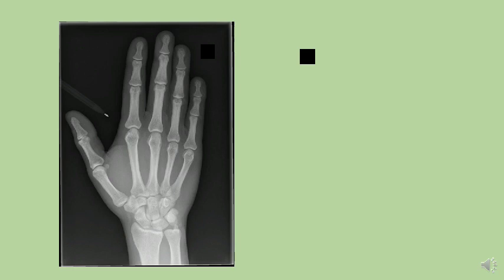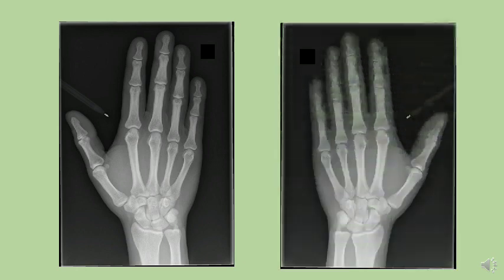This is a plain radiograph of a hand. Can you tell me which side it belongs to? I know some of you have decided on the right side and some of you on the left side. Now I flip the X-ray on the board. Can you decide the side now?